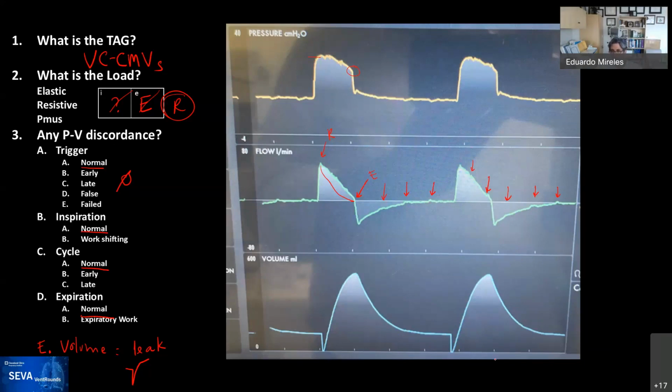The ones that have reached baseline, you will not see that discrepancy unless the patient is actively increasing the frequency or something. If you see a patient that has no activity, no patient activity is static, as you can see, unless they have changed the frequency, and these are the first two breaths, you should not see that discrepancy, or you should not expect that as a marker of auto PEEP. Does that make sense, Mike?